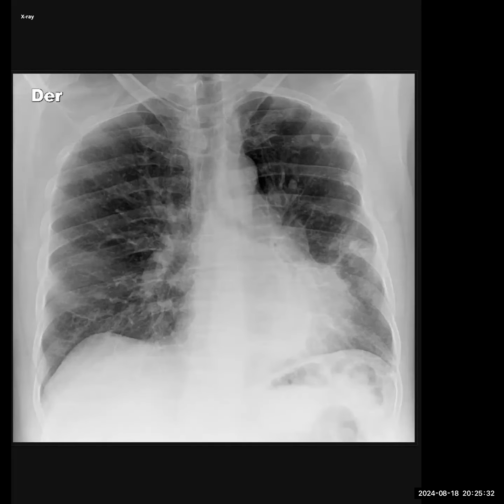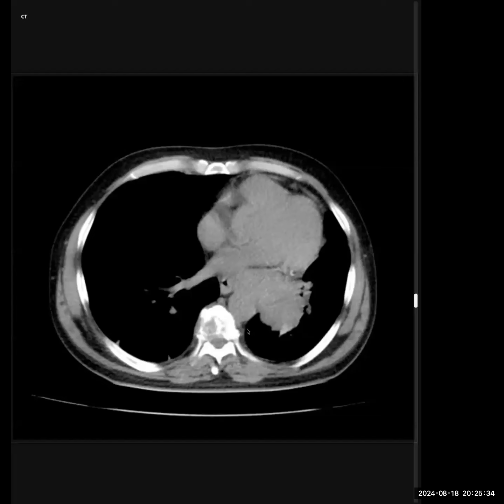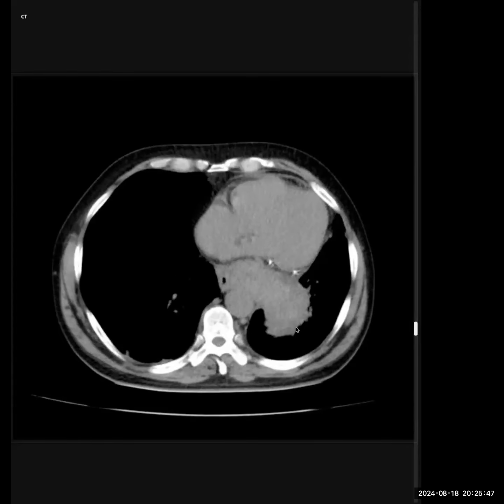Thank you. You can take a look at the CT. If you ask for control, I'll give it to you. Here you go. Just click once and start scrolling. It should work. Yeah.